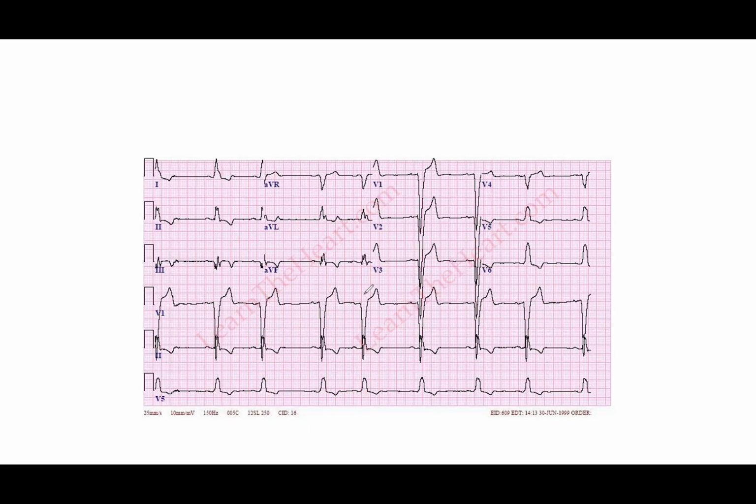So we got a sinus rhythm. We got some PACs. We also got some wide QRSs. Well, we know that's a bundle branch block because we got P waves with the wide QRS, right? And we're going to confirm it's a bundle by looking at V1, lead 1, V6. V1 is going to go down, negative deflection. Lead 1 has R wave only. V6 has R wave only. That's a left bundle branch block. So this would be a normal sinus rhythm, PACs, left bundle branch block. That's what this would be.